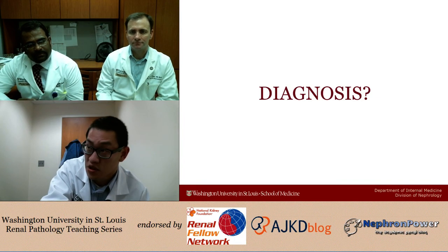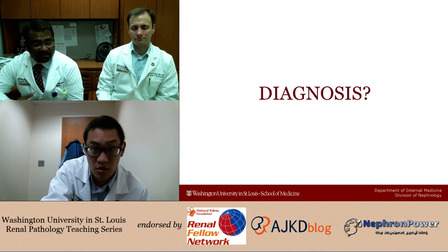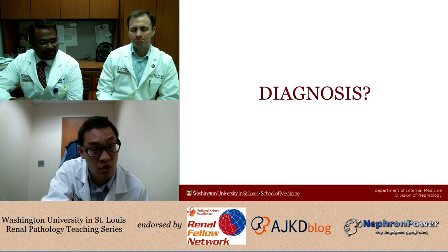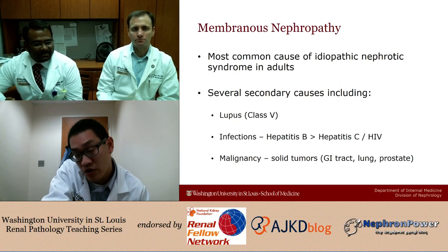All right, so your diagnosis. This is membranous, and I suspect it could be related to the cancer, maybe, but we can't say for sure unless I get more stains. Right. And that's difficult to differentiate.